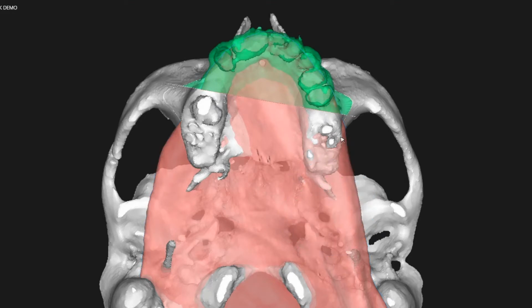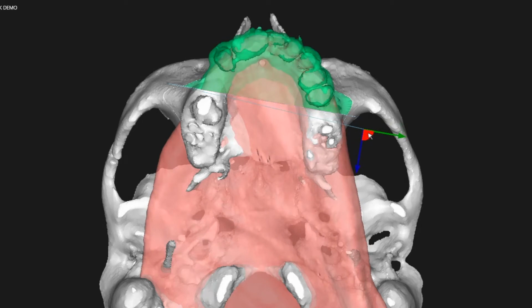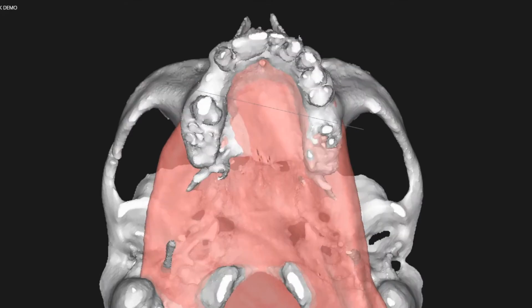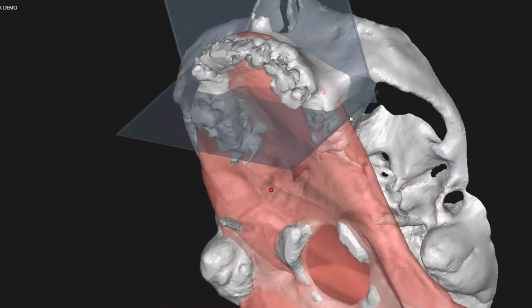Just draw that line back. That's perfect, because we'll have the pedicle coming out of that side then. Let me cut the maxilla one more time, and I'll make sure the scapula still looks okay. Yeah, that's good.